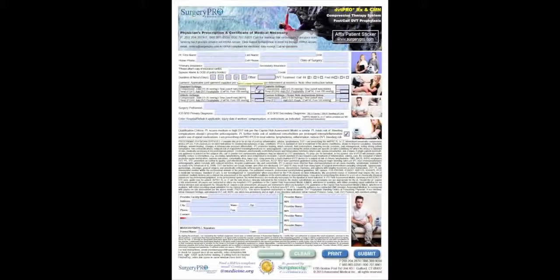That's required by Medicare. Surgery performed, we can say, left TKR, and obviously we'd spell it out, but that's very doable. And ICD-9, we'd put it in. I might indicate which hospital or rehab facility, and any other specific instructions here, tabbing between those lines. This checkbox allows us to speak with the carrier using the Caprini risk assessment, which is out of the University of Michigan, very common in terms of DVT prophylaxis. Facility name, we're going to go through how I can have this pre-completed in a moment, but you're going to get the idea. Date is next, and then the signature block.